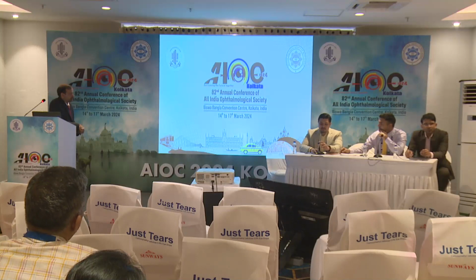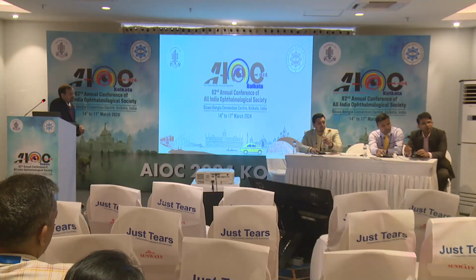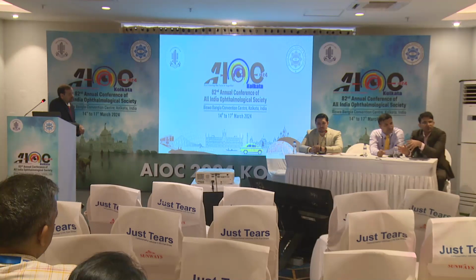I think other than the FAZ area, as I just showed, it's the circularity index that has come up. So even if it is not circular, if it is distorted in one part, it will signify localized ischemia. So rather than focusing just on the FAZ area, you may sometimes be interpreting erroneously.